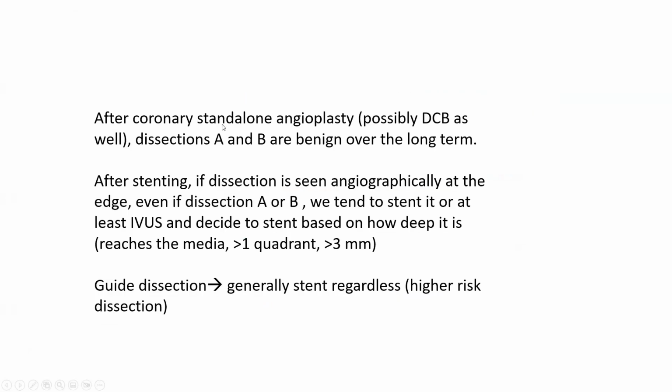After coronary stand-alone balloon angioplasty, dissections A and B are benign over the long term and do not necessarily require stenting. Now, in the setting of stenting, if you see angiographically a dissection at the edge, it often requires stenting, even if it is dissection A or B, except possibly if it is a dissection A or B that you can prove to be benign by IVUS, meaning it does not reach the media and is less than 1 quadrant. Now, if you have guide dissection, we generally stent regardless of that classification because guide dissection is always serious.